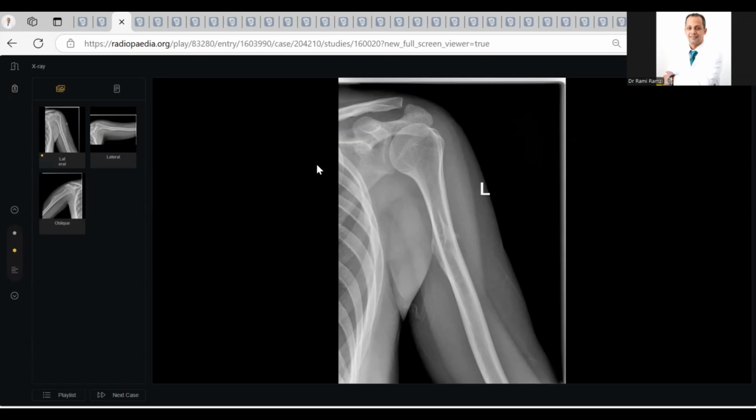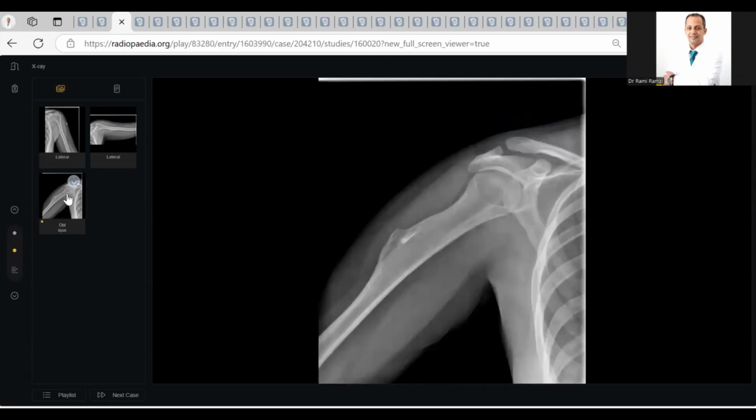Okay, sir. Provided is the frontal radiograph of the left arm with palpable swelling in a young patient. First thing I'm noticing is there is a periosteal reaction in the proximal shaft of the humerus, and there are some areas of sclerosis within the medullary cavity region at the same region. And in this orthogonal image, I can see this outward projection of the lateral cortex of the humerus.